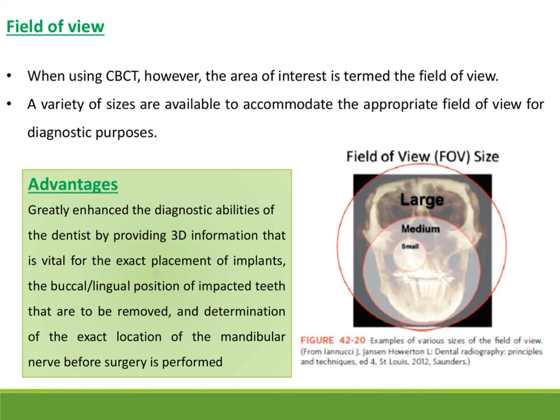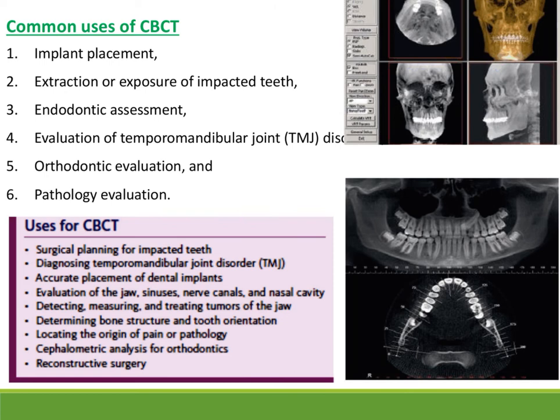Okay, so the advantage is that it greatly enhances the diagnostic ability of the dentist by providing 3D information. So, they can localize the impacted tooth to be removed and the location of the mandibular nerve, its closeness to the tooth before surgery. So, this will help us to expect any problem.